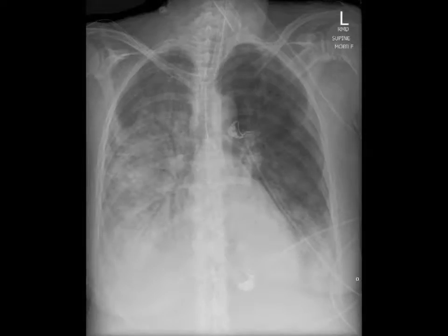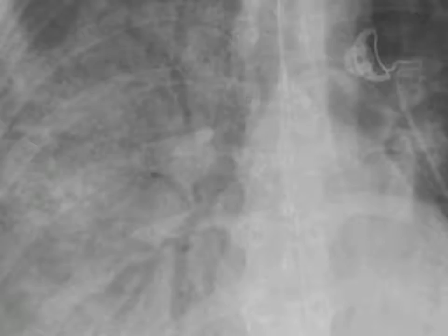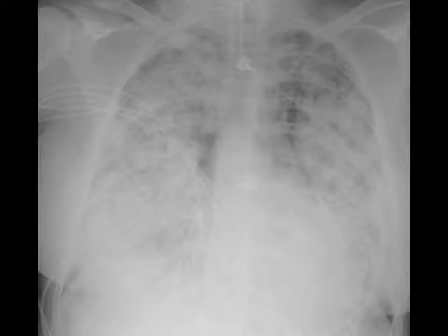Alveolar opacity causes dense whiteness. It is usually patchy, and the hallmark of this pathology is the presence of air bronchograms. Because fluid usually settles with gravity, the density is often most marked at the more dependent area of the affected lobe.